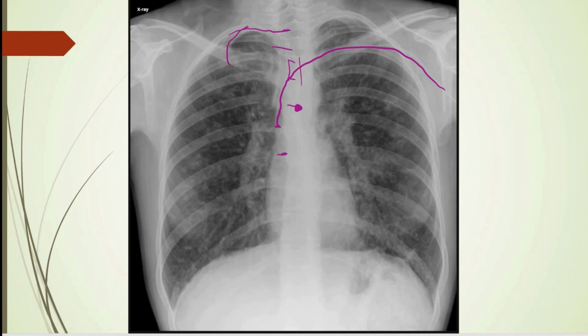And cardiac silhouette looks fine. Diaphragms look fine, gastric bubble. You look at the lungs, everything else, and it has good vascular markings all the way out. So I would say that central venous or central line here is appropriately placed.